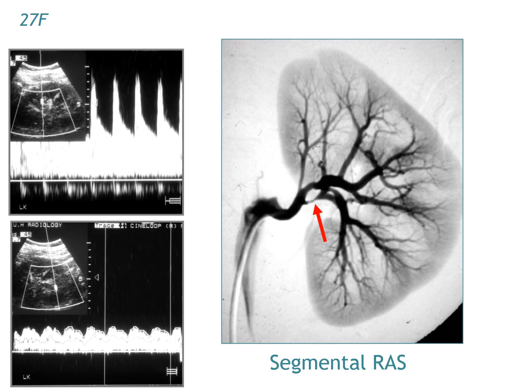Angiography clearly shows a significant stenosis of the segmental artery supplying the lower pole of the left kidney. As you see in this case, we may detect segmental artery stenosis if it is properly done in multiple renal areas.